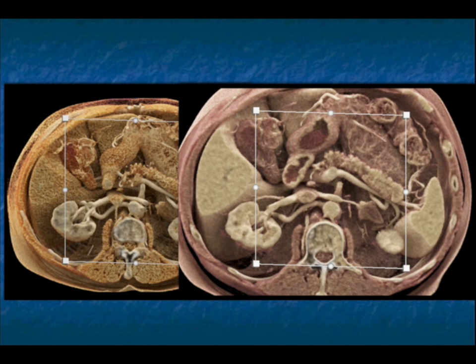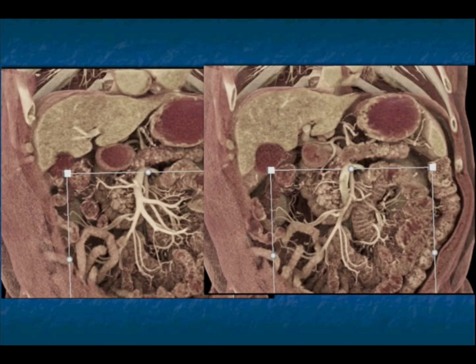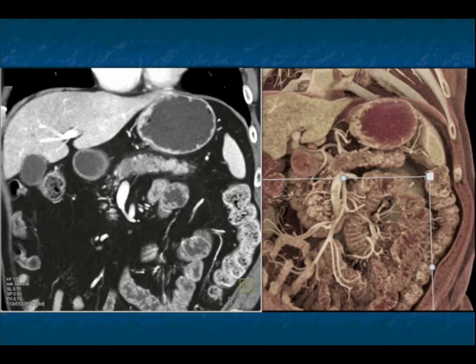There's the patient's tumor. There's the dilated duct right here. There's some of the difference in texture between the mass and the distal pancreatic gland. And again, here I'm showing you just a few more cinematic renderings, changing the texture mapping, and coronal view also nicely defining the portal vein and splenic vein in SMA, as well as showing you the tumor very nicely.